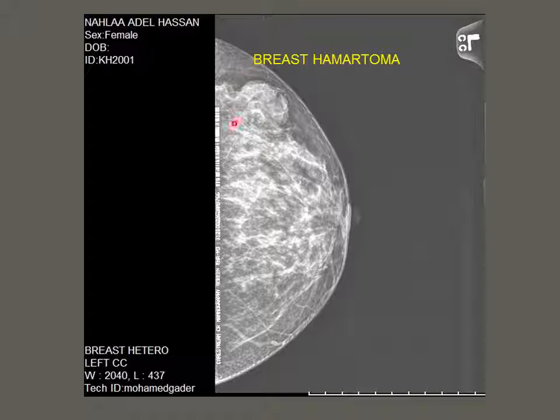The characteristic feature of this breast mass is that it has the same distribution, same features, same density as breast tissue. It is like breast tissue, not differing in textures and distribution of fibroglandular tissue, but is isolated with a capsule-like rim and well defined. This is called pseudo capsule.